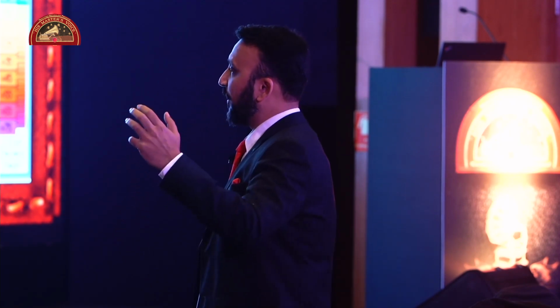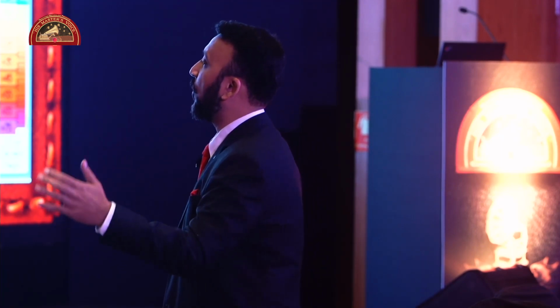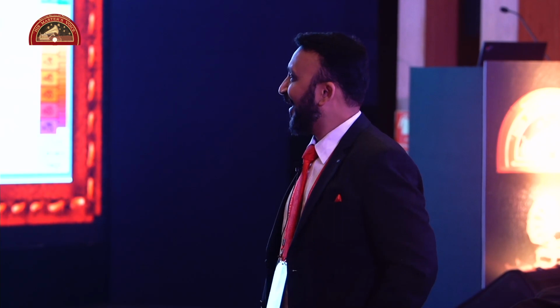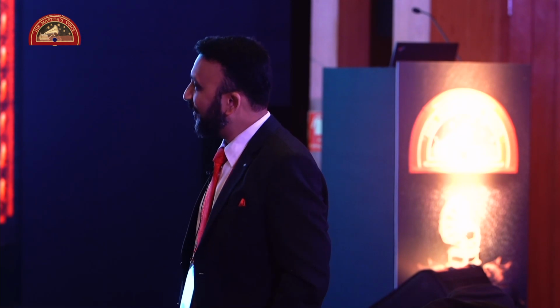But when the ambient illumination in the room is on the lower side, it does not illuminate the cornea. Earlier we used to be provided with a black cloth that we covered the patient's face with, so you don't need to switch off the light. But I don't find it very aesthetically pleasing to cover somebody's head with that, so we reduce the illumination. Generally, even in our diagnostics, we make sure that there are no windows at all in our diagnostic room. It's completely air-conditioned, and the lights are always dim, just on the floor, so that people can walk to their places. So that's what we do, sir.